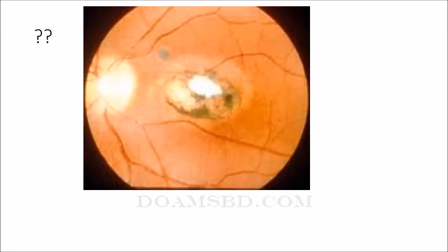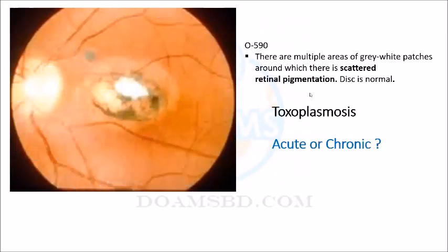And what will be the age and gender of the patient, possibility here in general? It is a quiz. Young patient. Young patient in reproductive age. Now you understand? Because toxoplasmosis is a disease of the immunocompromised state, more likely HIV. So HIV can produce such choroidoretinitis itself, and the opportunistic infection can cause the same. So this is more likely toxoplasmosis.